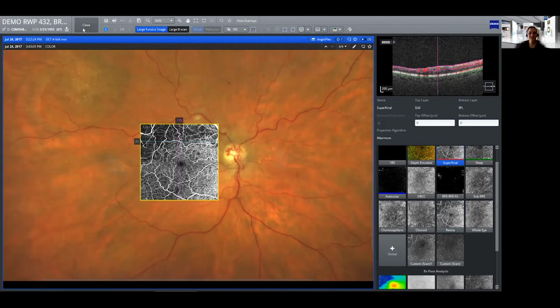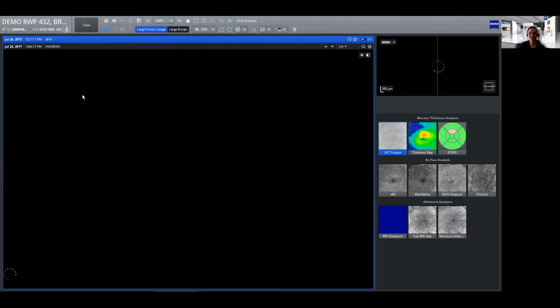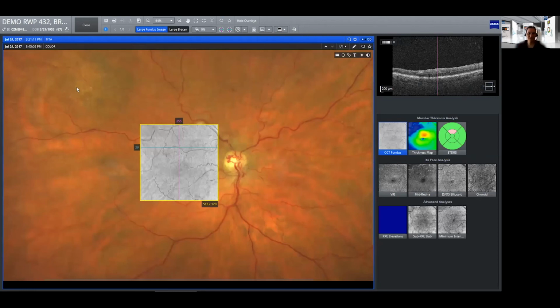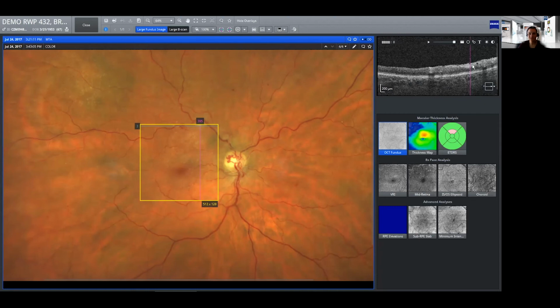And let's look at the OCT information that we have for that patient, because we don't have only OCTA information, we have also an OCT. This is the OCT for that patient, registered to the same fundus images that I've just showed you with the OCTA. I'm going to make this transparent. And we can see up here the cotton wool spots. And by clicking on those cotton wool spots, we can see them in the OCT right there. So very clearly cotton wool spots from earlier little infarcts. What we also can do, you see all the overlays that we have here on the right hand side.